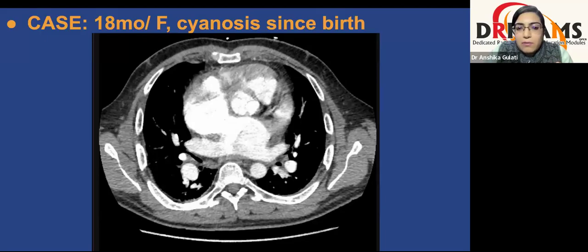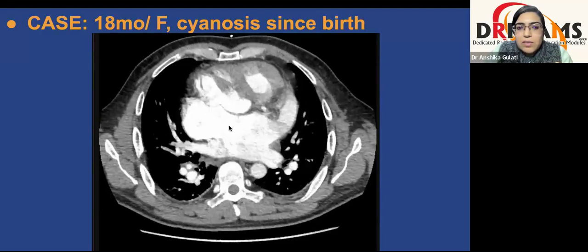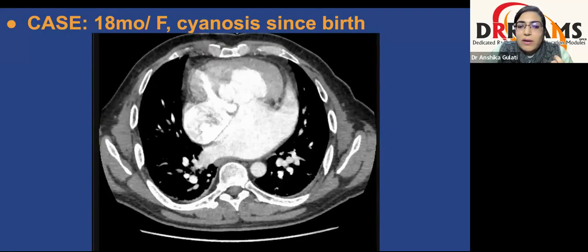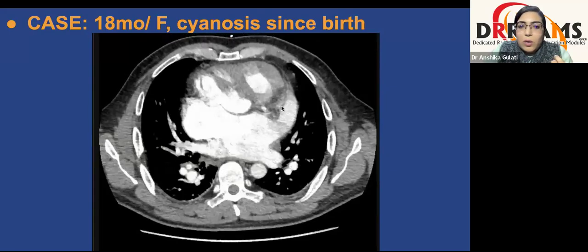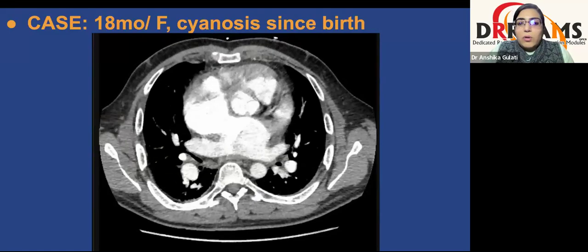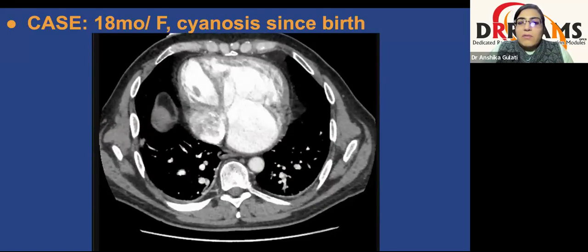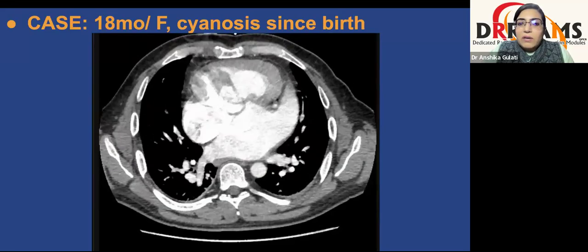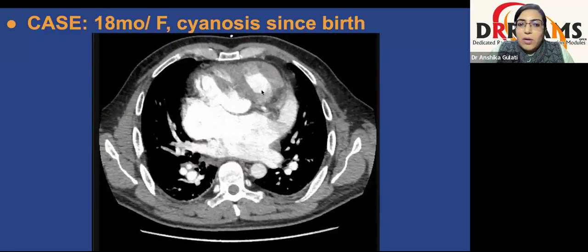And if you follow their origin, this pulmonary artery is arising from this morphological left ventricle and the aorta is arising from the morphological right ventricle with a subaortic conus. This is the conus, which suggests that the aorta is arising from the morphological right ventricle. So till now, what all do we have? We have situs solitus with AV disconcordance, with L type of TGA, with VA disconcordance.